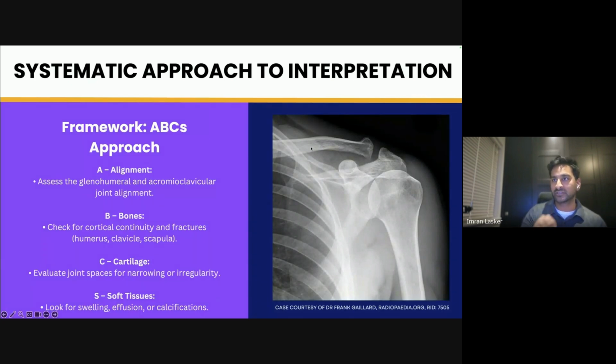So this is where I always say, try and go back to basics. When you're looking at an X-ray, first of all, just think to yourself, okay, do I know what bone looks like? Do I know what air looks like? And do I know what soft tissue looks like? So bone and air, we should really know, right? So outside the body is going to be air. We know that because nothing else is going to be around the body. So this must be air.